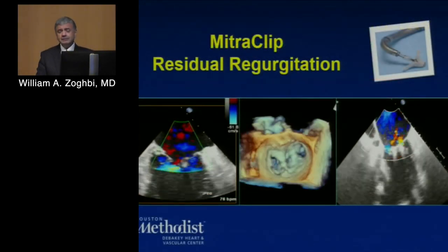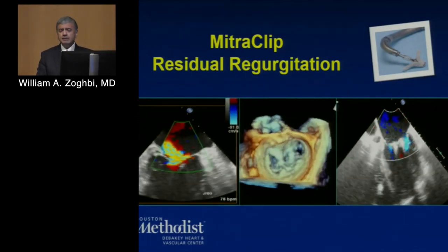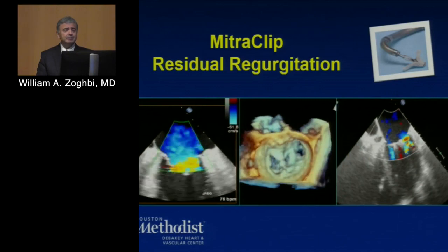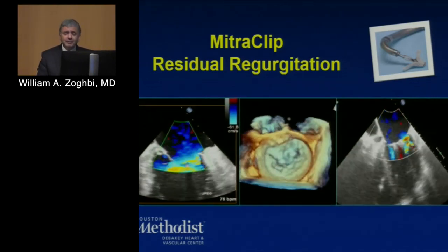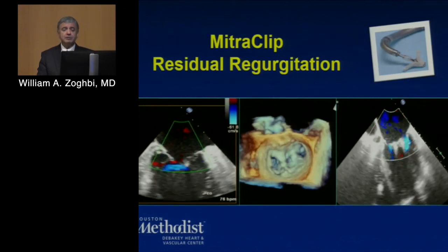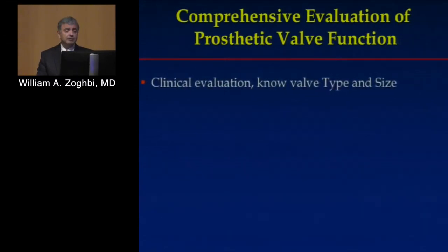And the challenge is equally there for a mitral valve clip. Not infrequently, it's usual to have more than one jet after you insert a clip. And what do you do with these jets, and how do you evaluate them? You look at the pulmonary veins, you try to assess how much is the regurgitation from one or the other orifice. You always have to be careful about how much stenosis you're also causing. So yes, it is a challenge. We acknowledge that, and we don't really have solid recommendations for you. Just be as integrative as you can ever get.